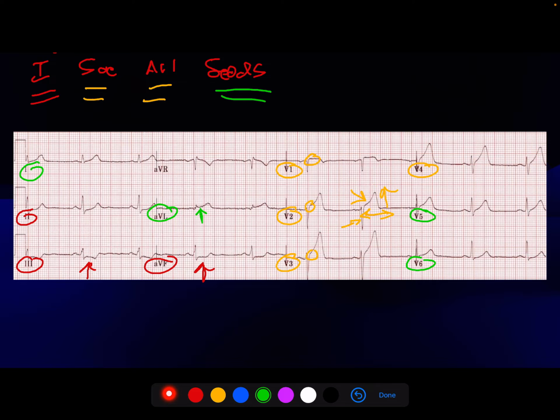Without the hyperacute T waves, if I just saw that little bit of elevation there, there would be something in this 12 lead that would push me to think about an OMI, an occlusion myocardial infarction, and push me to suggest this patient go to the cath lab. And that is this depression here in the inferior leads. This is a powerful finding.